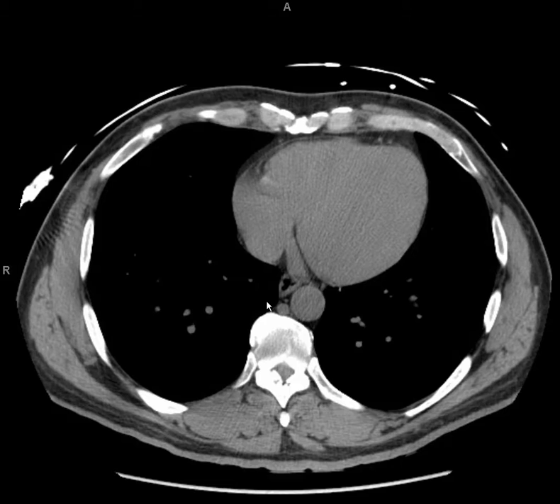Can you go over that again one more time? Yeah. So the esophagus in the neck is more to the left of midline. Okay, it's to the left of the spine and the trachea. In the upper chest, it's on the right. Okay. And then in the distal, right before it crosses over, it's again on the left.